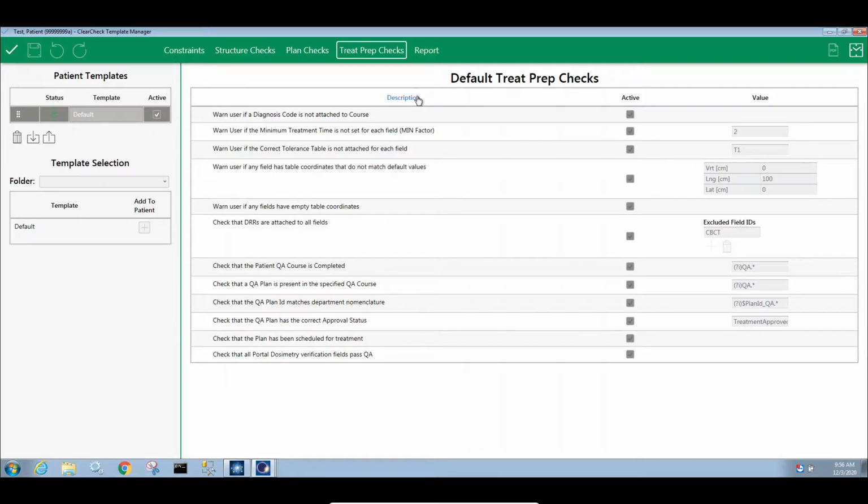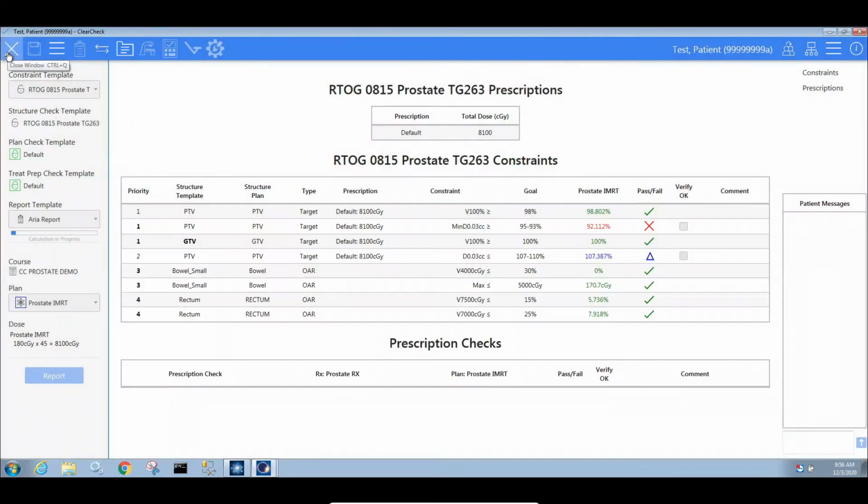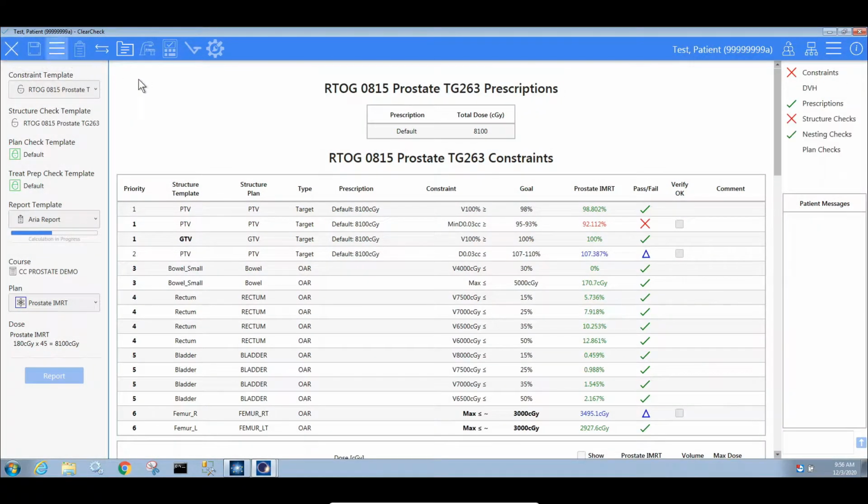So when you come in, you'll be able to preview them. You will not be able to edit them. So we'll spend a little bit more time in admin and I'll go over these in more detail. So let's just apply these and head into our evaluation workspace.